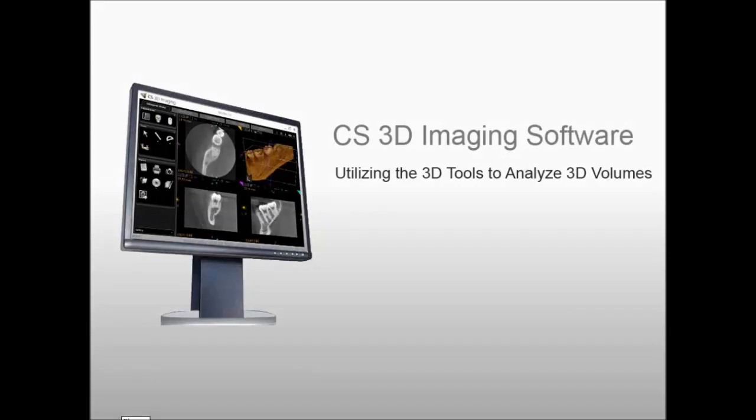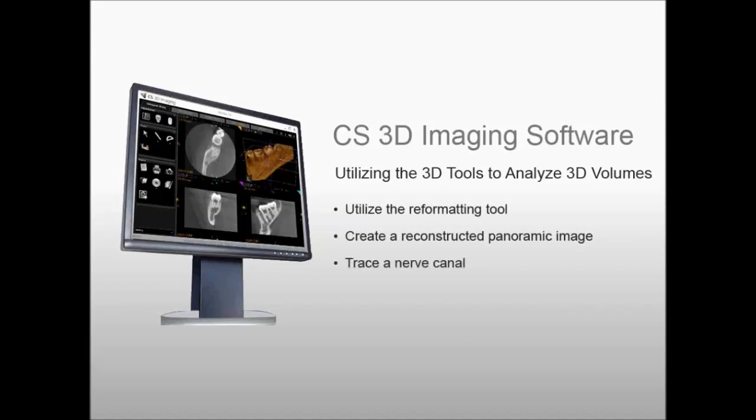CS 3D Imaging, utilizing the 3D tools to analyze 3D volumes recorded class. This recorded class is designed for clinical team members and provides instructions on the CS 3D imaging software tools. By the end of this class, you should be able to utilize the reformatting tool, create a reconstructed panoramic image, trace a nerve canal, perform measurements, and place an implant.